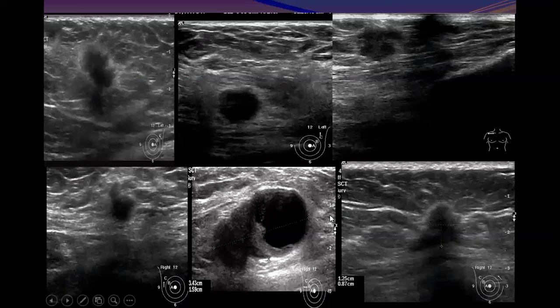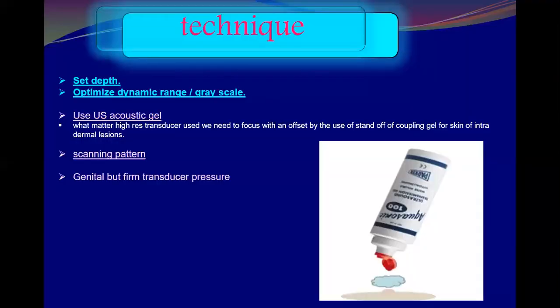So these all are my cases. You have seen this is just below the clavicle in the axilla, toward the axillary tail. Again, same in the axilla. This is at the mid-axillary line, same. And this is a cancer in the extreme superior medial breast.